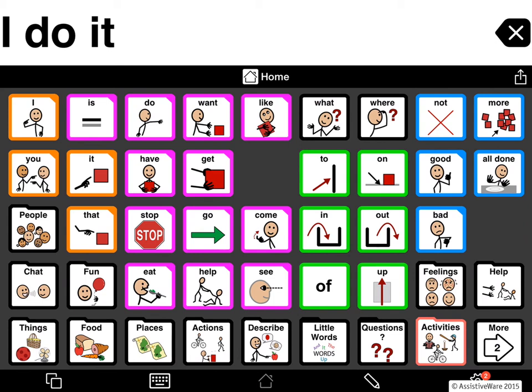If you're working with someone who has really poor vision or no vision, but reasonable fine motor skills, you can try auditory fishing.